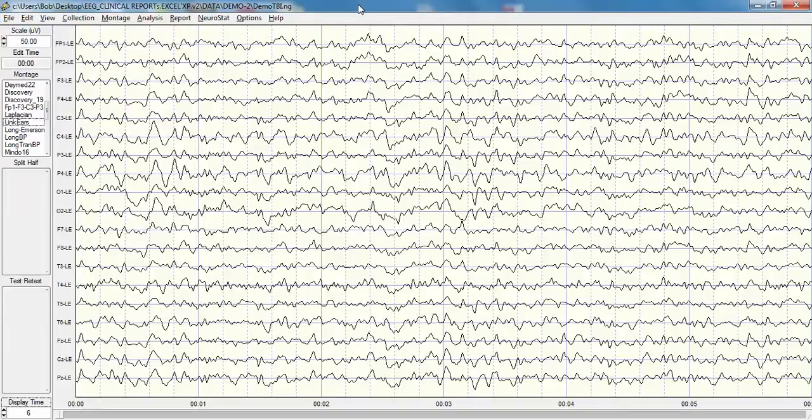In this case, we've imported EEG from a patient who was struck in the right parietal region by a bat. This has resulted in spatial neglect to the left side of the visual world, and also where the patient does not shave the left side of his face, and also has paralysis and weakness on the left side.